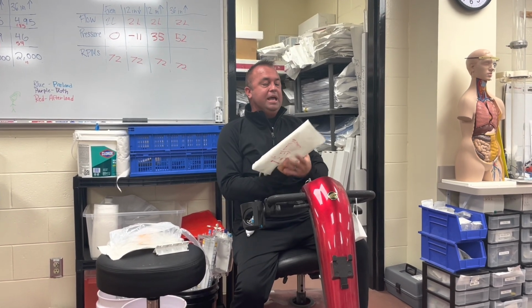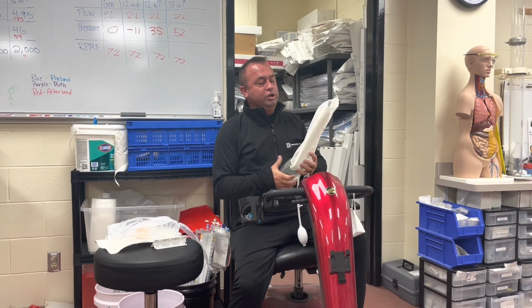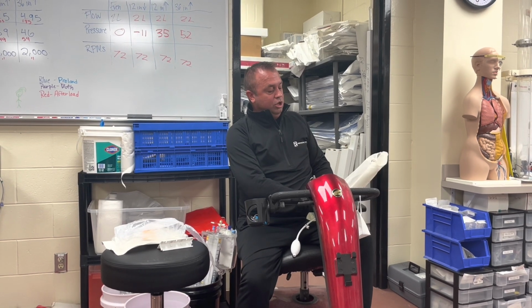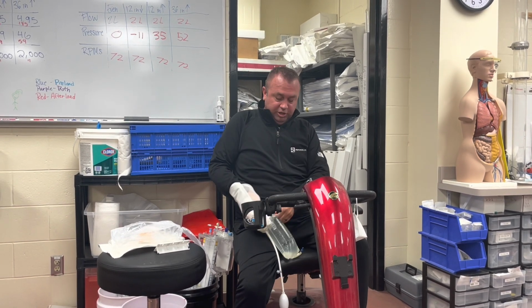So the bag of saline goes into this pressure bag. Now, some of these pressure bags have a little hook inside to put these in, others don't. Some people don't hook these bags of saline into these pressure bags at all. I will give you a little bit of a hint.